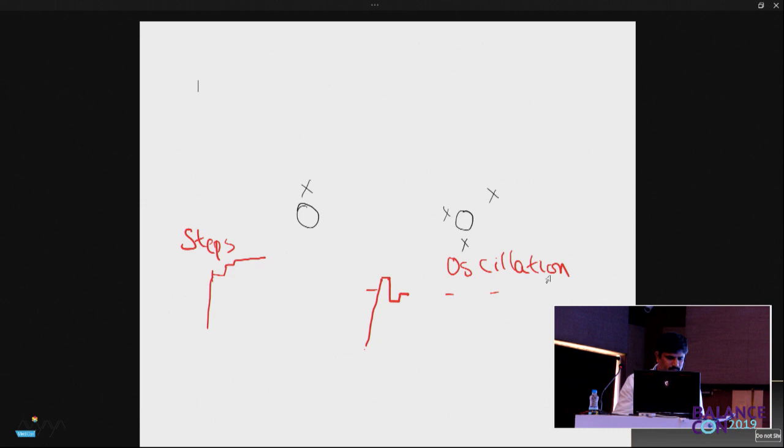Now, in eye movements, there are the movements we saw, and there are saccadic movements, which are considered as ballistic movements.